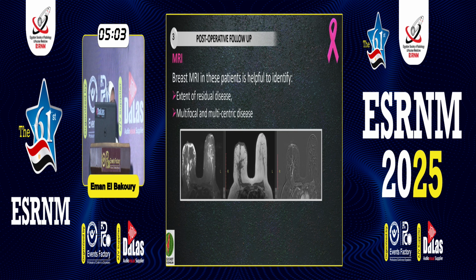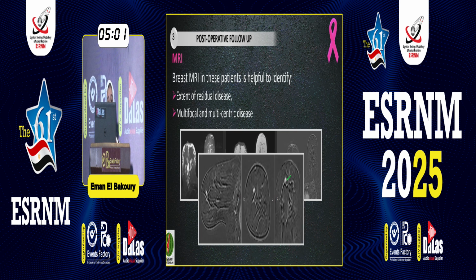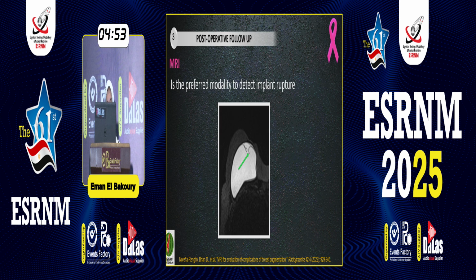This is again a case of positive margin, and here we can see the contralateral small lesion that proved to be a synchronous carcinoma that was occult in mammogram.